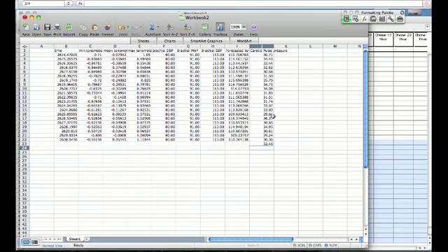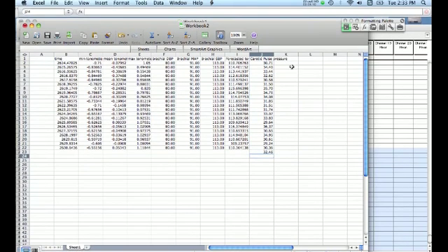So you'll use that in your calculation of arterial compliance and beta stiffness index. Those equations you should be familiar with and are in the O'Rourke paper, and that's that. So the next tutorial will probably be on what you do with your diameter analysis once you've got them out of the Brachial Tools diameter program.